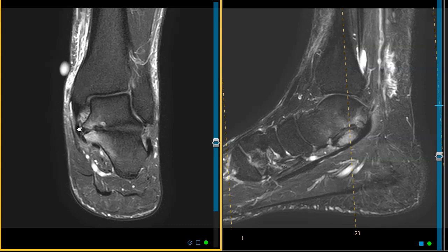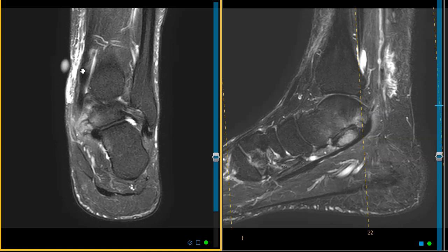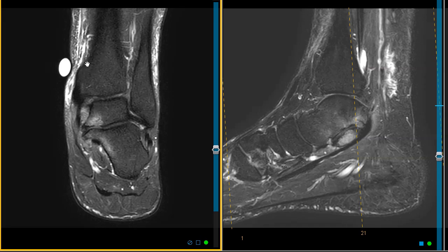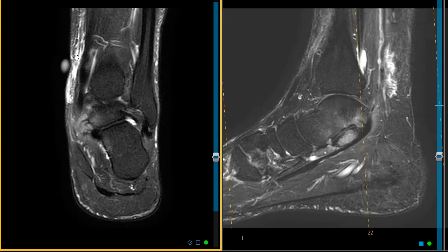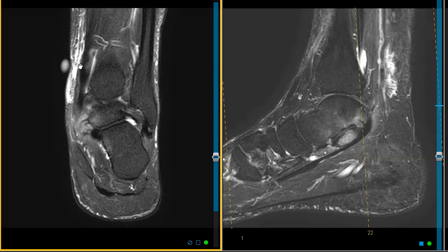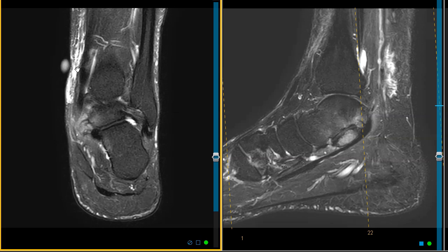In this patient, this tendon, the posterior tibial tendon, goes right past that. If we look above the joint, there's fluid right here in the tendon sheath. It's distended, so it looks like this patient has some tenosynovitis, or irritation of that tendon as it goes past that coalition. And the fluid is built up here, and there's subcutaneous edema. This is all in the subcutaneous soft tissues above the ankle joint. And so the pain, even though this coalition is down here, the pain is up above that, and it looks like it's related to this inflamed tendon sheath and the inflammation in the soft tissues up here.